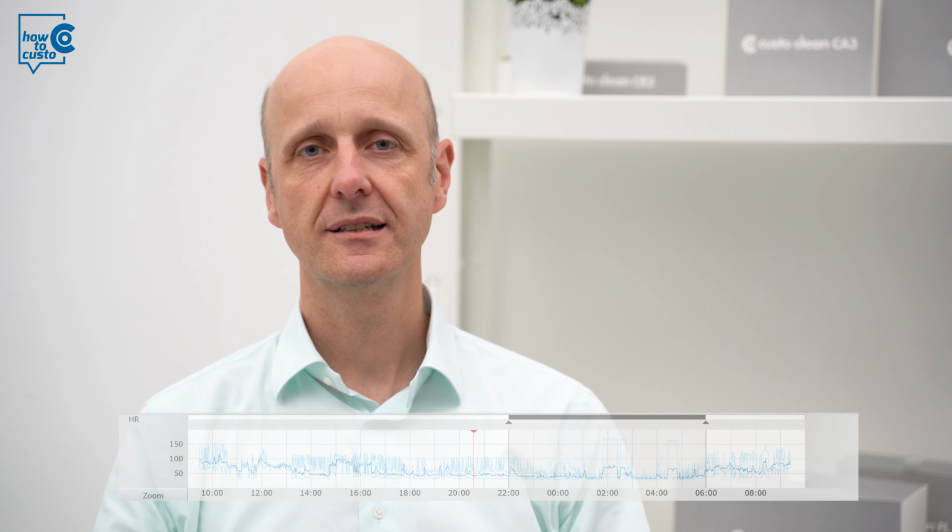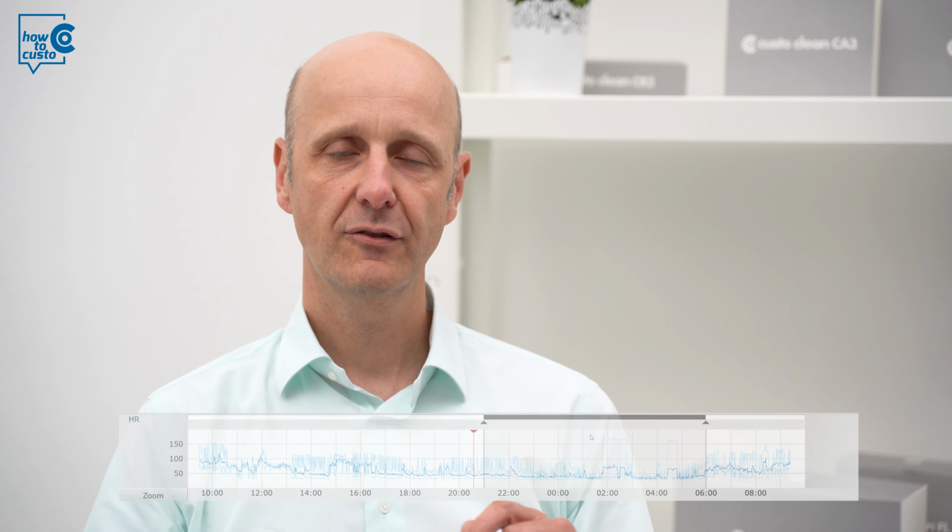In addition, you can differentiate between day and night phase in the overview of the trend ECG. The night phase is represented by the slightly greyed area between 10 p.m. and 6 a.m. with the black bar above. This is an interactive field, which means that you can grip the beginning and the end of the night phase with the mouse and move it to the times specified in the diary.